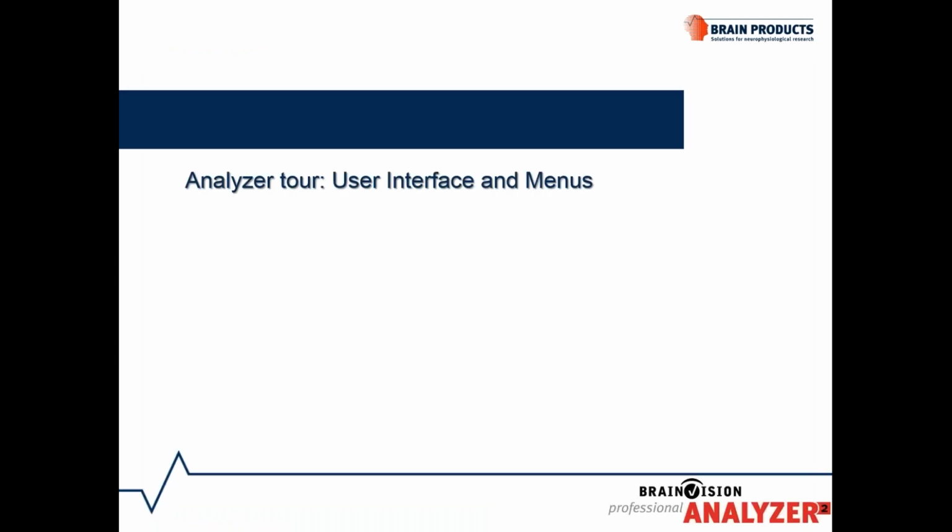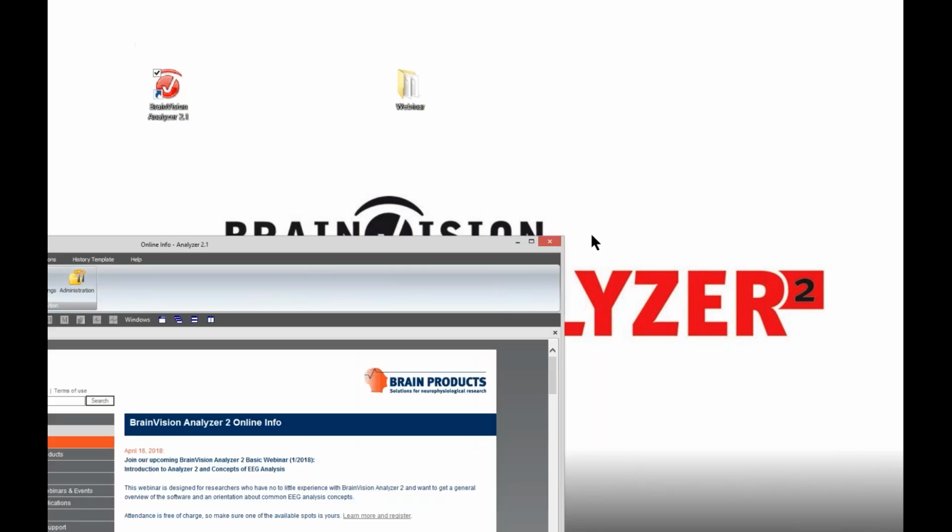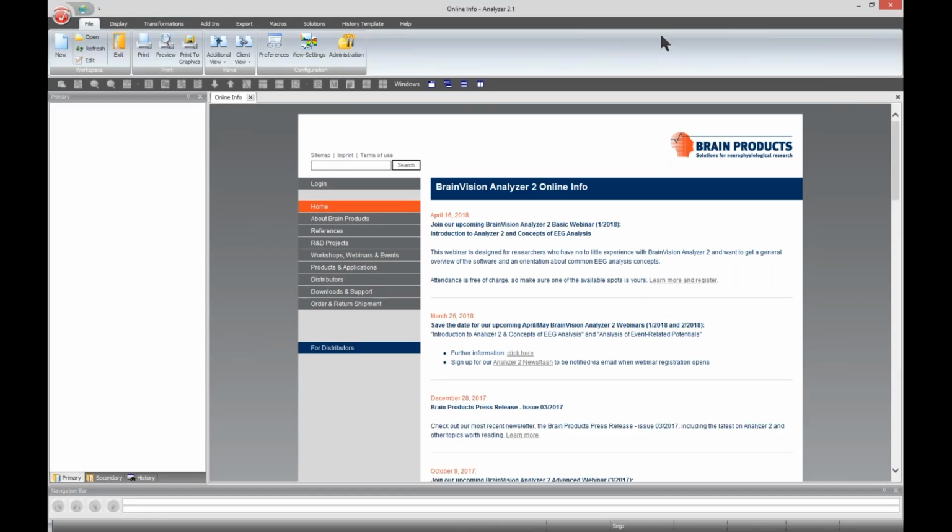So now let's start Analyzer. And for that, I will quickly close my slides. After default installation, you will find the Analyzer icon on your desktop. I have a dongle plugged in locally with a valid license on it. I start Analyzer. And it actually appears on the other screen, so I move it over for you. And when you start it for the first time, this is what you will see.